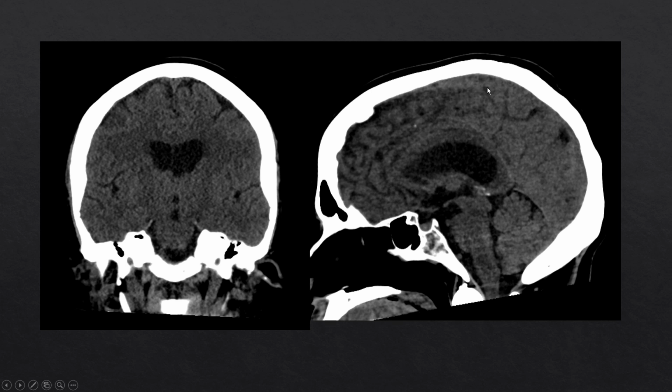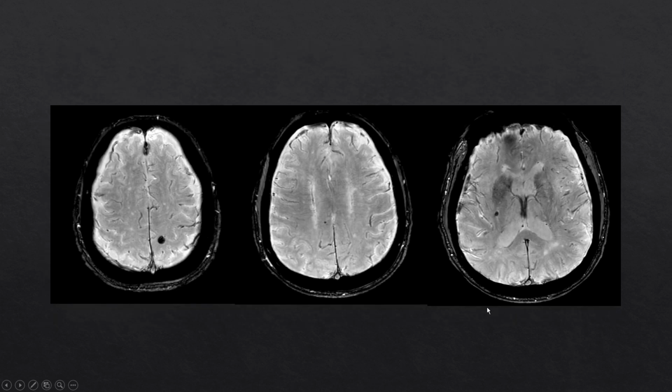And as you have more severe degrees of diffuse axonal injury, you have involvement of the corpus callosum, the splenium of the corpus callosum, and in very severe cases of diffuse axonal injury, you'll have the brainstem involved. Anytime you're evaluating for intraaxial intracranial hemorrhage, you want to look at susceptibility-weighted sequences.